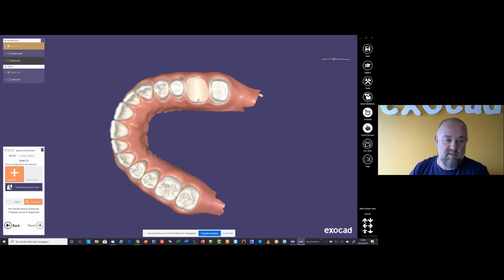And if you have this opportunity in the scan software, I'd recommend doing that, because most scan software on the market is able to do the registration with the point cloud before it is triangulated. And it might be that then the accuracy is higher. I don't want to say that the accuracy of our registration is not good, but if you have a scan software which is able to do that, you can do it there.